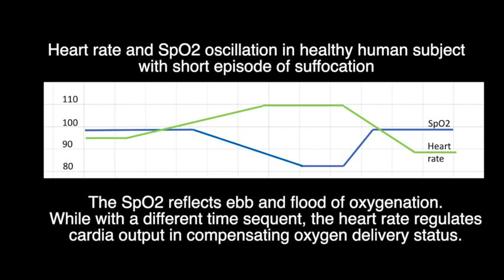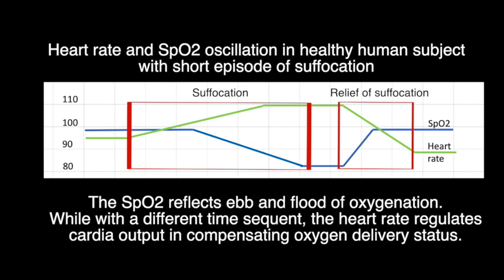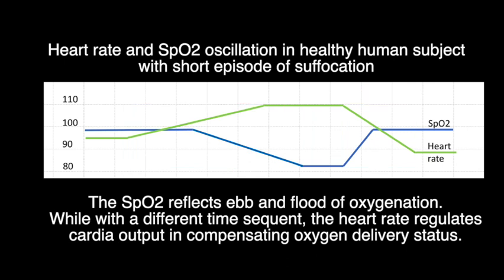The SpO2 reflects the ebb and flow of oxygenation, while with a different time sequence, the heart rate regulates cardiac output in compensating oxygen delivery status.